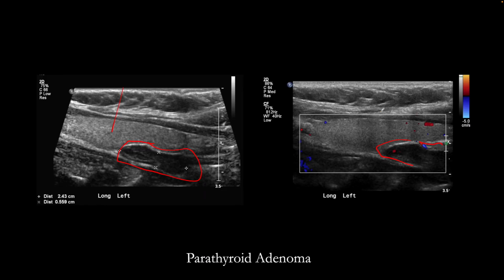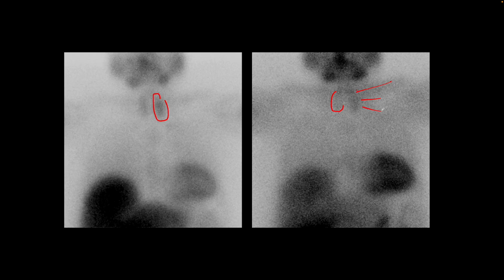This is the parathyroid scan from the same patient on the early images acquired about 5 to 10 minutes, up to 15 minutes after the injection of about 20 millicuries of technetium-99m Sestamibi. We see asymmetric increased uptake in the left lobe of the thyroid. The quality of the image is not very good, but sometimes that's what we get. And on the delayed images, we find that the normal uptake in the right lobe of the thyroid has washed out, but there is persistent focal uptake in the left lobe of the thyroid, which corresponds to this focus that we saw earlier, posterior to the inferior pole of the left lobe of thyroid, consistent with the parathyroid adenoma.